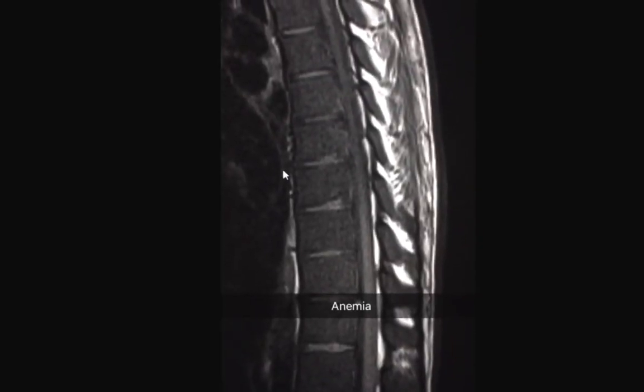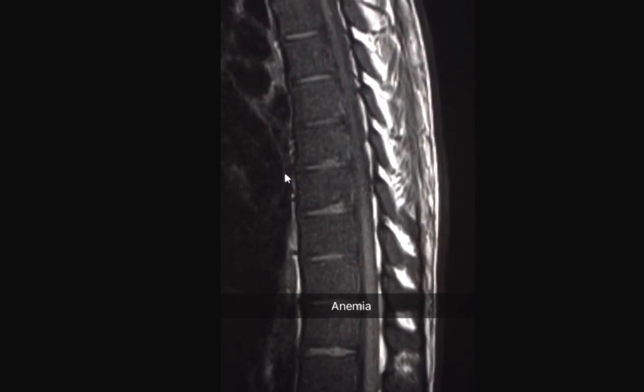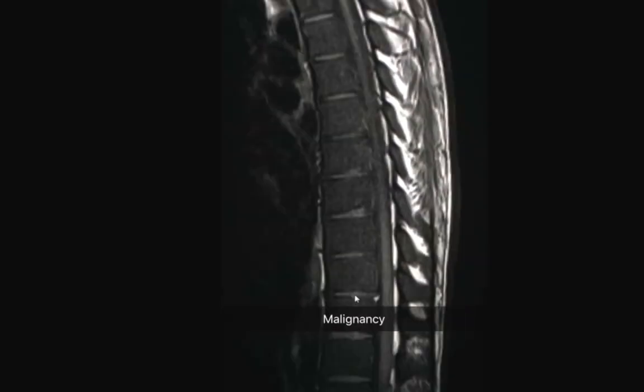So what is the differential diagnosis for diffuse low signal intensity of bone marrow? Low signal intensity of the bone marrow could be a response to chronic anemia, such as sickle cell anemia or thalassemia. Low marrow signal intensity could also result from malignancies such as metastasis, myeloma, lymphoma, or leukemia.